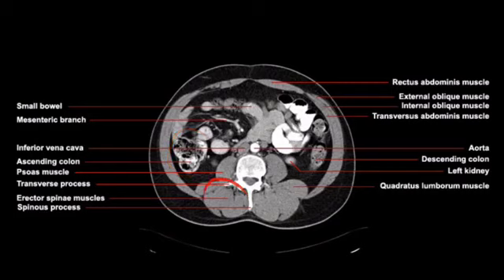We can still see those Erector Spinae muscles. Something else we can see at this point is another muscle which is associated with the abdominal cavity, and that's called the psoas muscles. These psoas muscles are actually inside of the abdominal cavity. We remember that they're different from the Erector Spinae because the Erector Spinae muscles are on the outside, psoas muscles are on the inside. It probably goes without saying, something we haven't mentioned to this point in this lesson is that this anterior structure here is what we call the rectus abdominis muscles. These are your typical abdominal muscles.